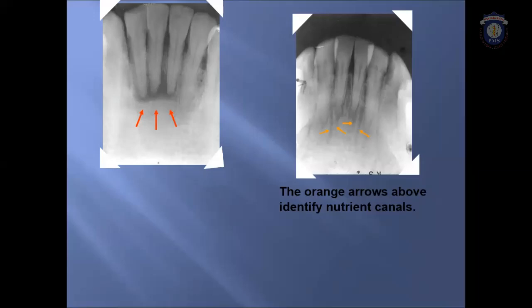Here in this figure, there is a radiolucent lesion which is present in the periapical region of the mandibular incisor. But this should not be mistaken for mental fossa, because here it is an associated periapical lesion or a periapical abscess associated with these mandibular incisors. Here you can clearly see the lamina dura of these three teeth is missing. By confirming the vitality of the mandibular incisors, we can clearly see this is the periapical lesion associated with mandibular incisors and not the radiolucency of the mental fossa.